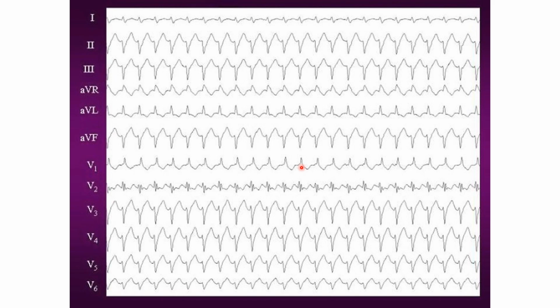Belhassen's tachycardia has some features, that is QRS will be relatively narrow. In this lead it appears like that. Here also there is probably there. But overall I would not say that it is relatively narrow. It's a really wide QRS tachycardia only. Belhassen's tachycardia is an important type of idiopathic fascicular tachycardia.